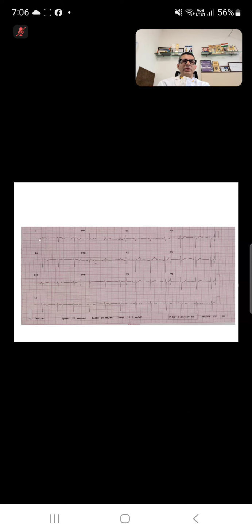You can see that in L1 the P wave is negative and in aVR the P wave is positive. So that indicates that it is actually lead misplacement or it has to be dextrocardia. It cannot be right ventricular hypertrophy. So any condition in which the right atrium is to the right and the left atrium is to the left, L1 will have a positive P wave and aVR will have a negative P wave. If you have L1 as negative and aVR is positive, that means the right and left reversal has occurred.